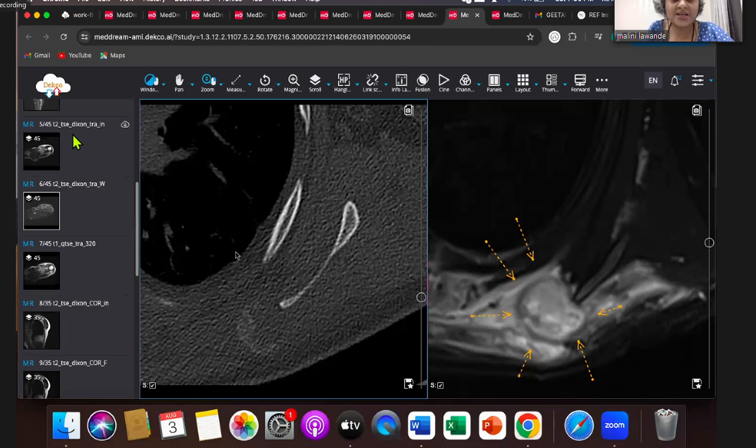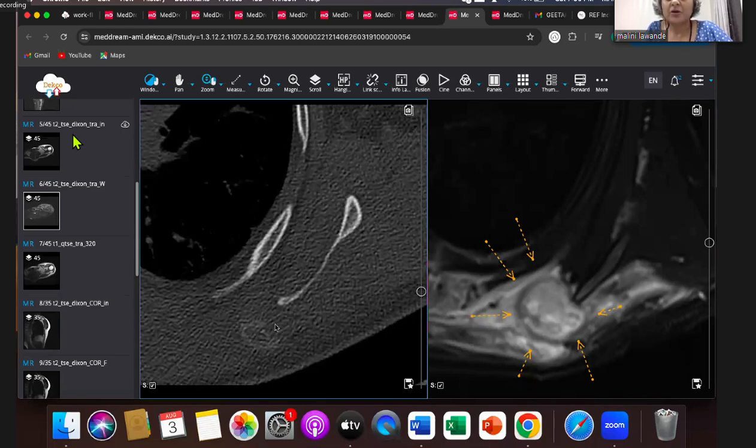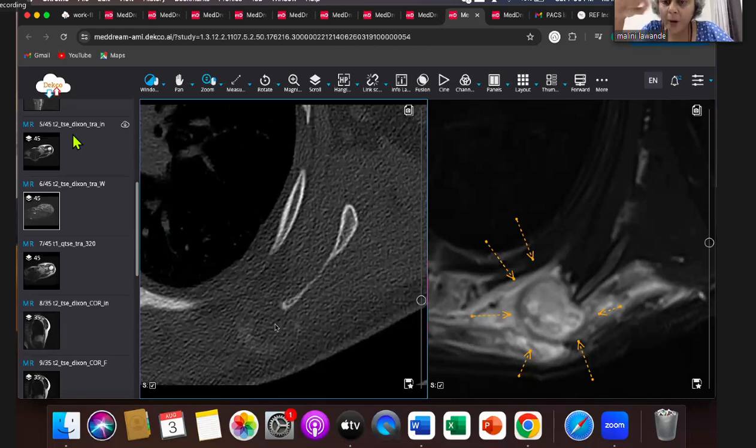But the question is to know when to do the CT cuts. If you think of this as a soft tissue sarcoma or an abscess, then you would not take CT cuts. So remember, a hypointense periphery, much more disproportionate edema. Just look at the radiograph or do CT cuts, and it is myositis ossificans.